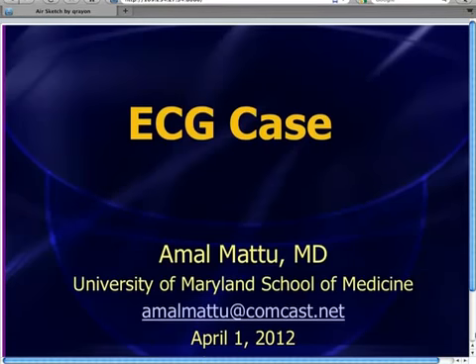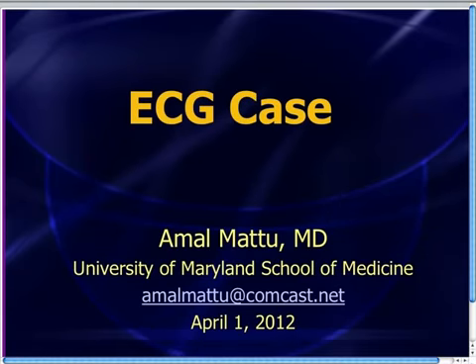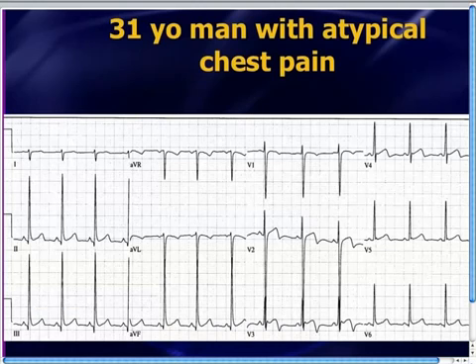Well, welcome everyone to the EKG case for the week of April 1st, 2012. Before we get going with this case, please make sure that you review last week's case where we talked about Wellens sign or Wellens syndrome, because we're going to continue on with that theme.